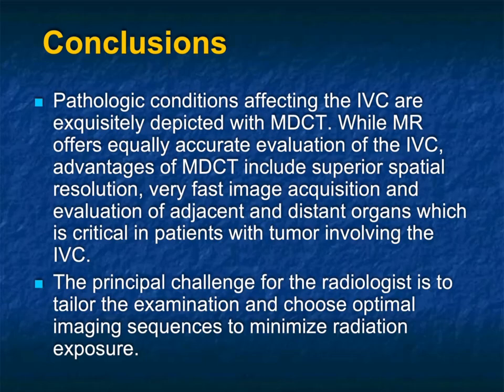So conclusions, I've gone through a number of pathologic conditions affecting the IVC, nicely shown with CT. Again, I mentioned if you're uncertain at times, MRI can be helpful. Occasionally, ultrasound can be helpful. However, in the scheme of things, CT usually allows you to make the right diagnosis.